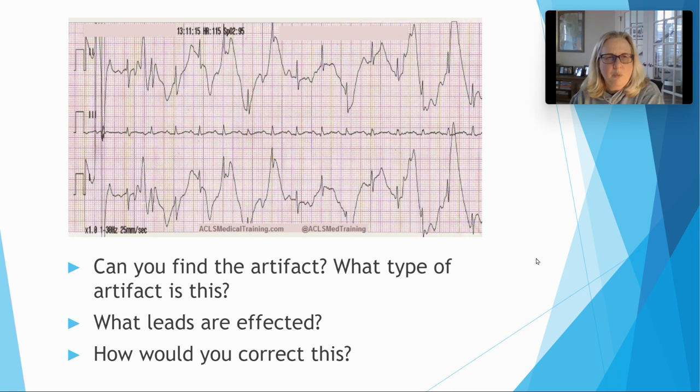So this is actually what it looks like when the sticker isn't laying flat. Okay, so it's like the sticker's up on its side or twisted. It kind of looks like this. It doesn't know what it's supposed to look like. So it just kind of picks up something here and there and it makes it look really funky. Okay. So I would say it's probably the sticker isn't laying flat.